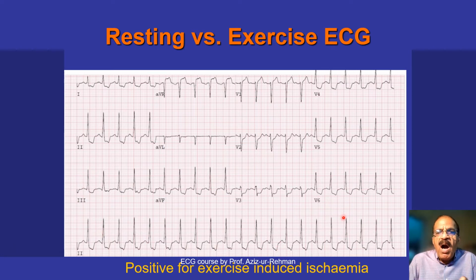So there is marked ST depression in all these, and so there is global ischemia in this patient. There may be critical coronary artery narrowing, although the resting ECG was normal. So this is important, and of course this patient requires monitoring.